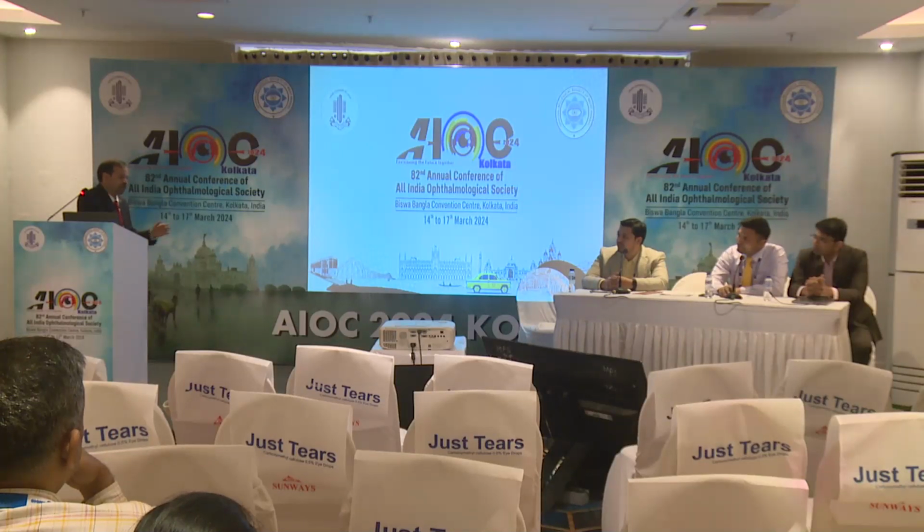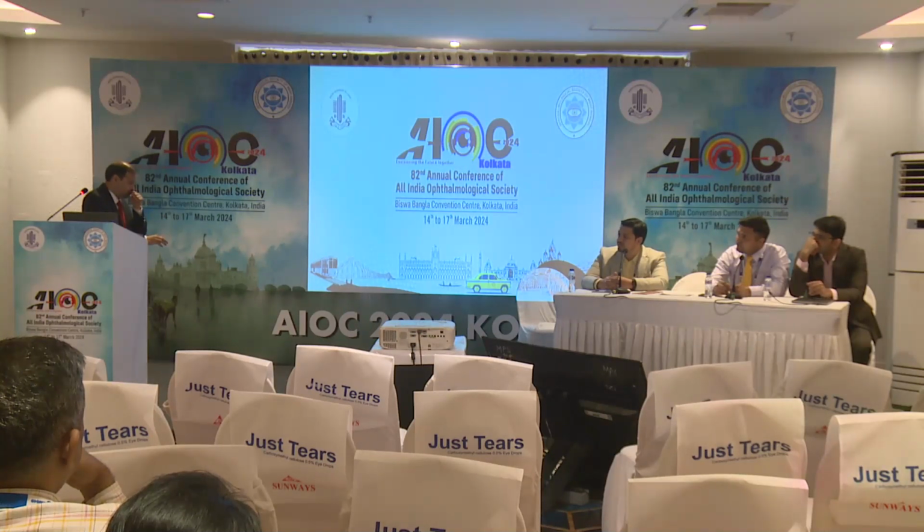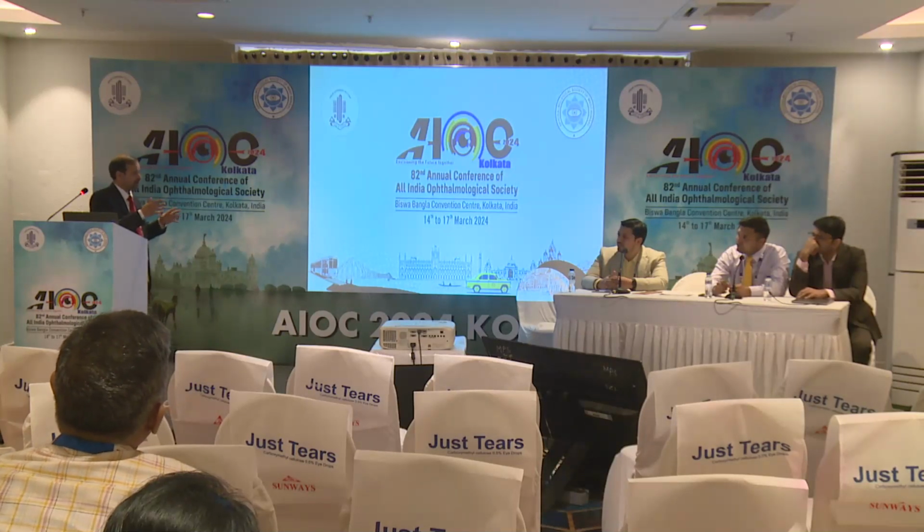The reason being, I think we know that with ultra wide field, one change that happened is we know that there are two kinds of diabetic retinopathy. One kind predominantly involves the posterior pole, while the other kind involves the peripheral retina. We call it predominantly peripheral lesions, and it has been shown conclusively that patients who have more peripheral lesions tend to progress more. So I think 130 degrees is still kind of mid periphery, and we are not able to see the periphery.